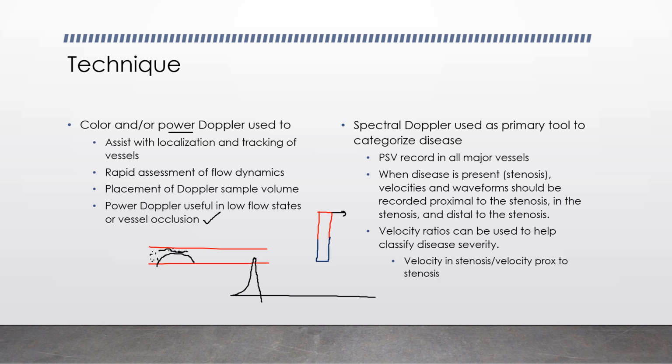If there's lots of resistance ahead because the muscles don't need a lot of blood flow, you're going to see it fall below the line in early diastole. And then when that hemodynamic pump or Windkessel effect kicks in, you're going to get this slight little brief bump of forward flow again through end diastole. Okay. So this is a pretty high resistance but very normal waveform if you have a patient that is at rest.